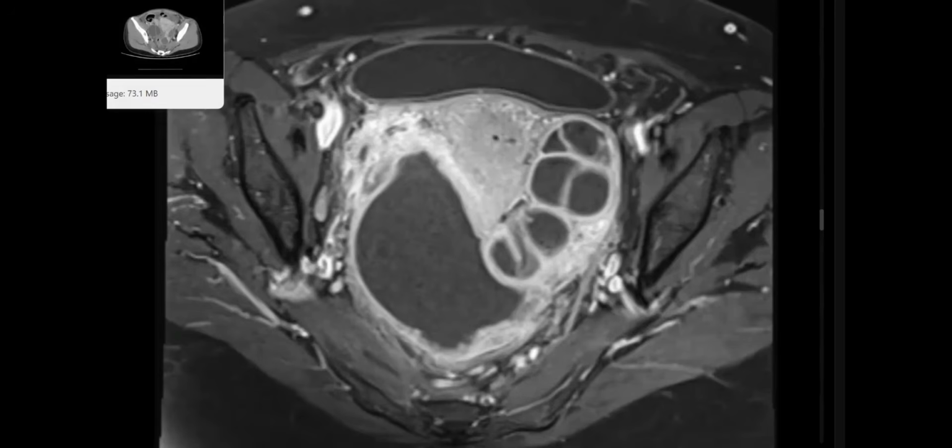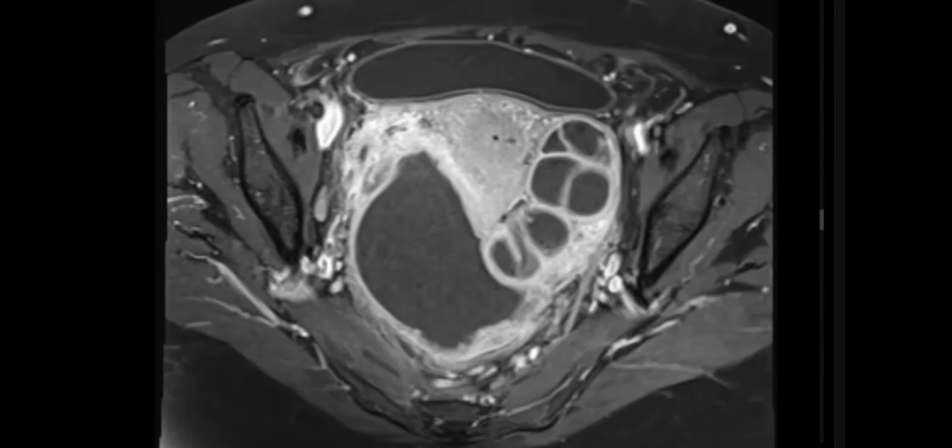So the second category, we have a fever, so suspecting infection, either PID or post-operative. It's proteinaceous fluid, so abnormal signal usually on T1, and more important on T2.